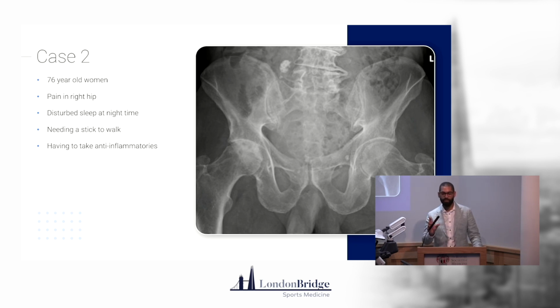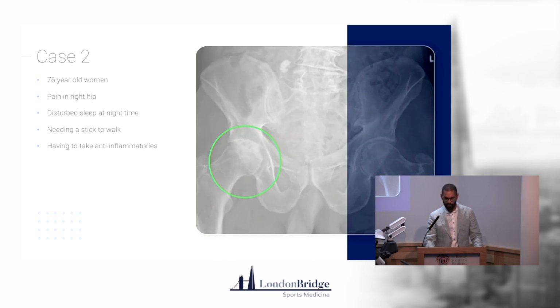We talked about what happens with the offset with an OA hip and the movement mechanics. They're undoubtedly going to get a bit of glute med flare and glute med tendinopathy. So you're much better off picking up the true pathology with an X-ray, and it's a screening tool as well, right? To look out for any other sinister pathology. So I think X-ray would probably be my go-to in this lady. Last case.